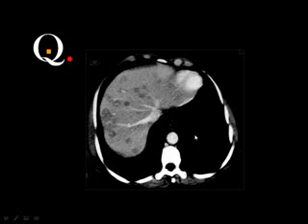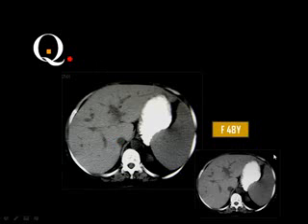Then this is the aorta, and this is the inferior vena cava. This one is the inferior vena cava. And what do you think about this vessel? Which one? Yes, this is the inferior hepatic vein. Then you know the inferior vena cava, which is adherent to the liver in this section, is the landmark for the superior segments. Then which segment is this one? The number of the segment? 2. Okay. 4. 8. 7. Very good. Okay.